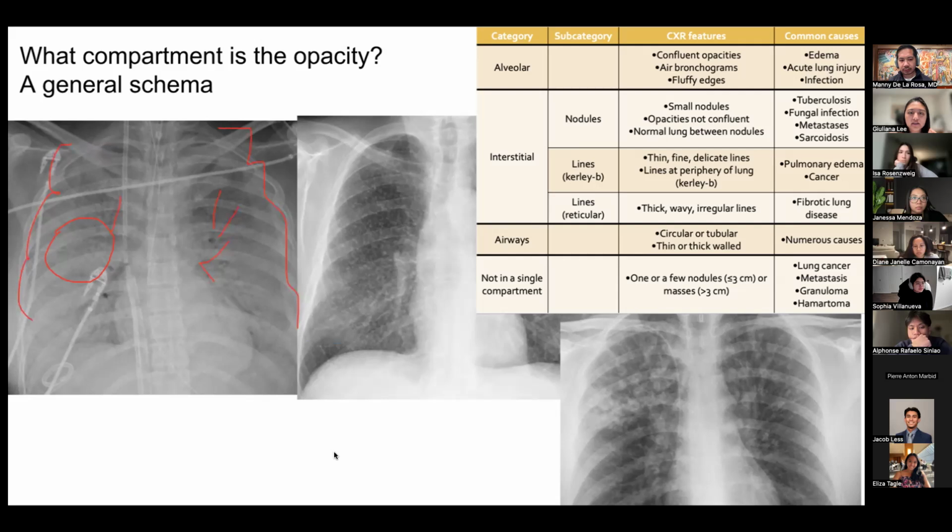All of these signs point to the fact that the fluid or the opacity is in the alveolar compartment. And that's exactly where your gas exchange is happening. So this is very classic for someone who might have an infection or someone who has edema of some sort.